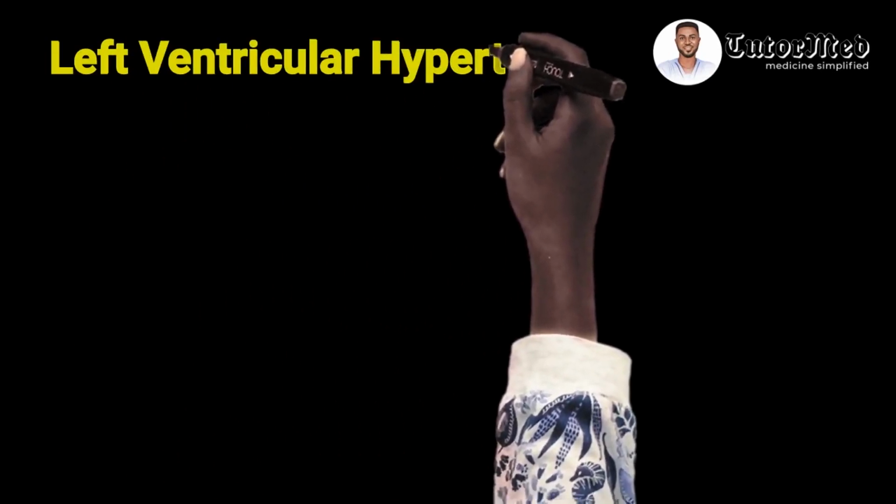Very good, so let's begin with left ventricular hypertrophy. Before that, remember we've already established that when examining waves on the ECG, we get MAD at them. So M for morphology, A for amplitude, and then D for duration. For ventricular hypertrophies, the component of the MAD which is of importance is the amplitude.